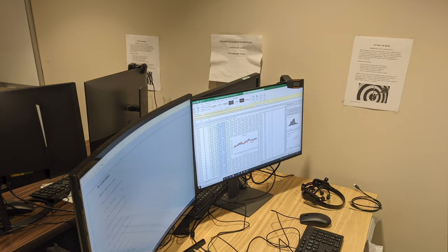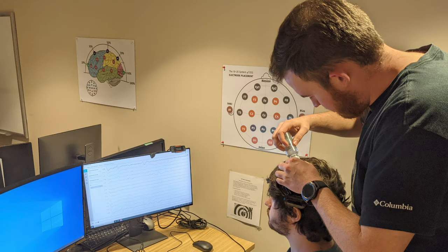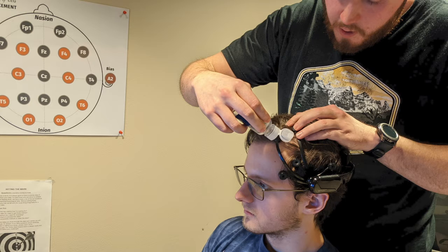During the setup phase, the participant would be asked to sit in front of dual monitors at an i9 mid-tower desktop and place the EEG device on their scalp. The EEG device was then adjusted by the researchers, and saline was added to the felt tips to ensure good contact and EEG signal quality.